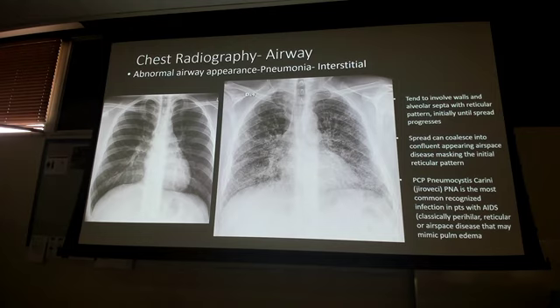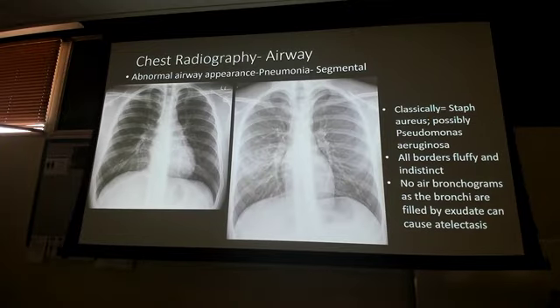On top of that, I have a very specific patient subset that typically gets infected with interstitial pneumonia, right? That's another clue to help you distinguish between the two. But with imaging alone, go off of the graininess, the diffuseness. It's a bunch of pieces of sand versus that segmental kind of pneumonia in the different airways in that area. Does that answer the question?